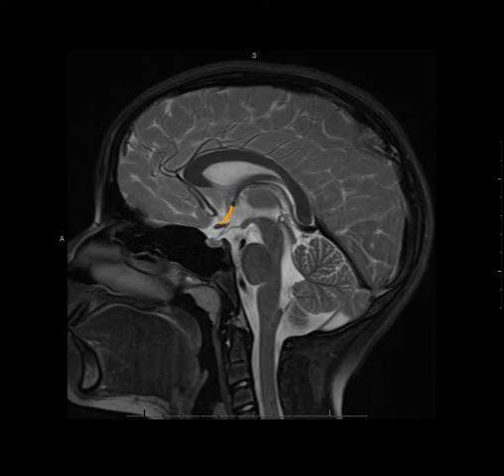A thin band of white matter called the lamina terminalis connects the anterior commissure to the optic chiasm, which is somewhat oval-shaped. This leads to a little reflection, and the first of the anterior recesses of the third ventricle, called the chiasmatic recess. The second recess is called the infundibular recess. Infundibulum is Latin for funnel. The fibers coming down from the hypothalamus into the pituitary stalk form this funnel as they head towards the neurohypophysis.